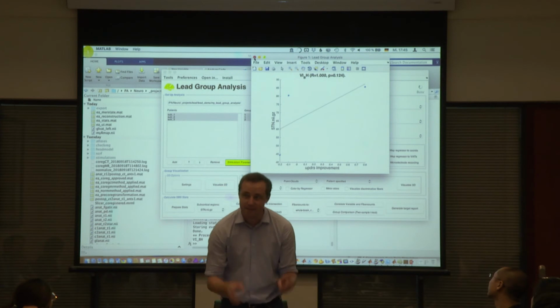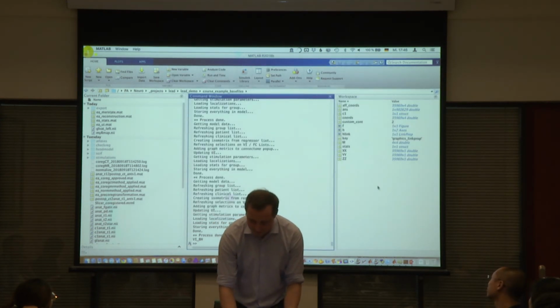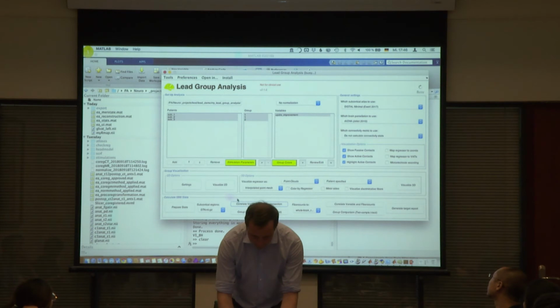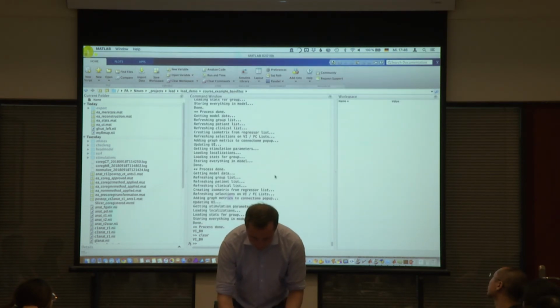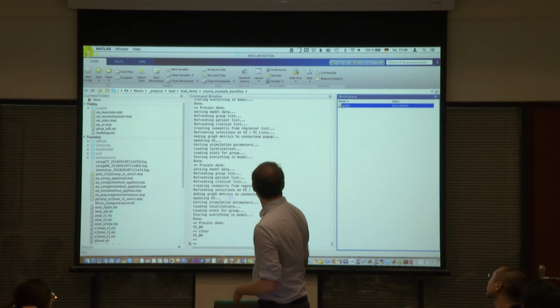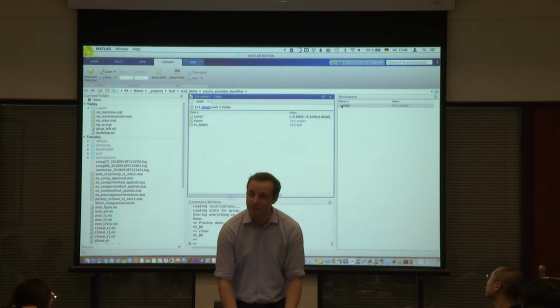Once I press that, and that's important, now you also have, in MATLAB, let me check again. I think now you get the raw data here. Yes, so this stats variable just appeared, and you can use that and export it to Excel or whatever and do whatever you want with it.